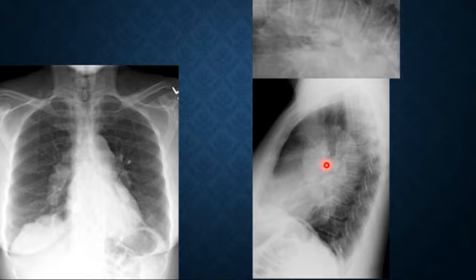Before I show you, what does it mean? Wait. Aortic figure of 3 sign. Aortic aneurysm. Sorry? Unfolding of? Okay. Next.